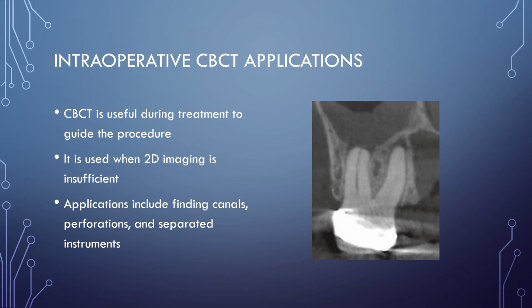As a clinician interpreting this mid-treatment scan, your focus shifts to immediate problem-solving, such as mapping the specific location of severely calcified canals, pinpointing iatrogenic root perforations, or analyzing the 3D position of separated instruments. By taking this focused scan, you transition from blindly searching to precisely navigating the anatomy, allowing for a much more targeted and conservative approach that prevents unnecessary removal of tooth structure or further iatrogenic damage.